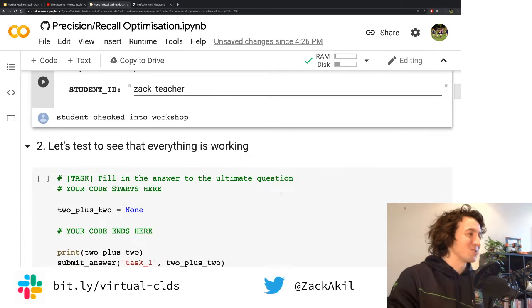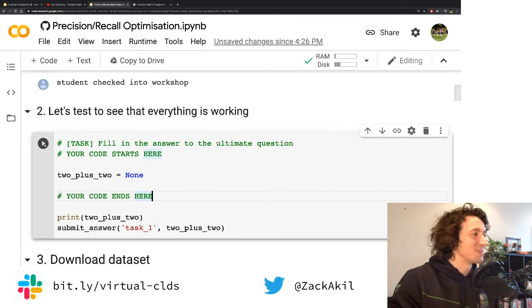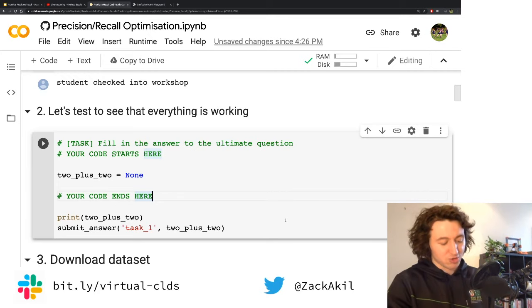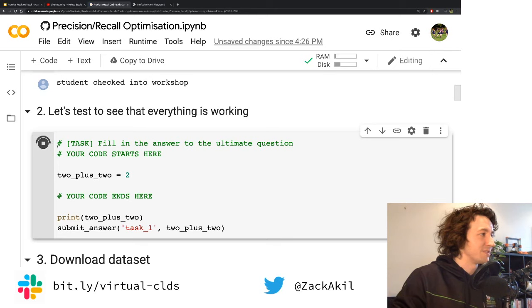And we're going to start with an easy question. How do you run these cells? You click the play button, or you can hit Control Enter or Shift Enter. So pick your poison. For this first question, I'm going to be bold and get it right first time. We'll see.